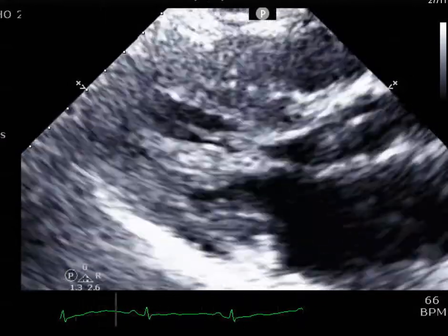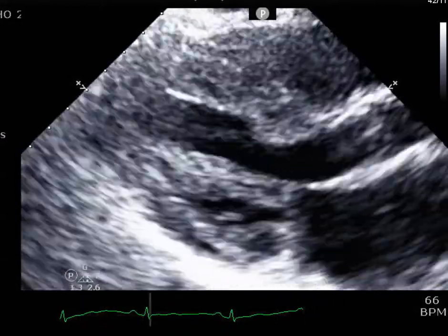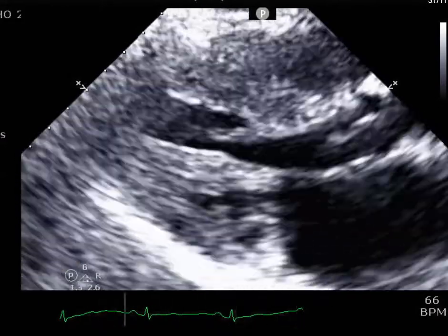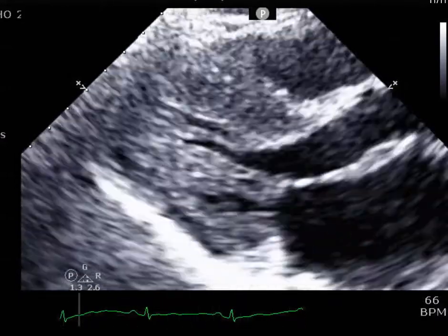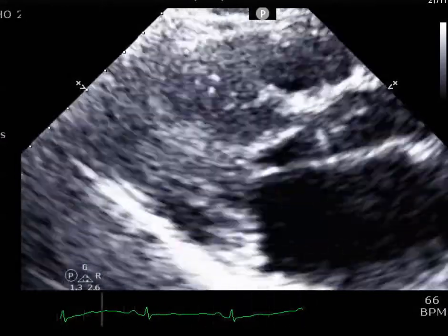Hi everyone. One of the residents today had asked me to comment on the study of whether or not there is hypertrophic cardiomyopathy and outflow obstruction. And one thing I cannot emphasize enough is that outflow obstruction, the idea of the LVOT obstruction, is a physiological state that can happen in a lot of disease entities. It is not a disease entity in and of itself.